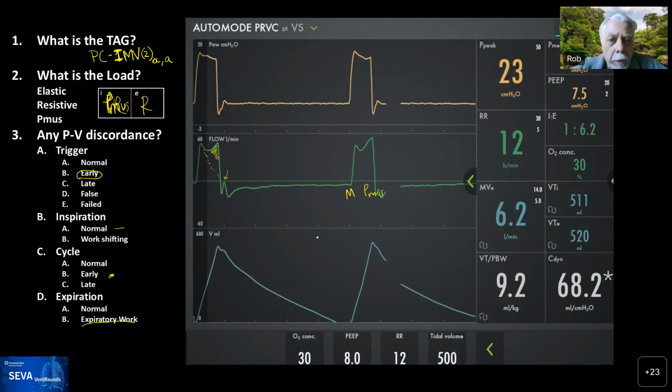So yeah. Auto PEEP causes failed triggering. And in this patient in particular, what I can tell you is that when we repeated the measurements, we were attempting to wake up the patient, during a spontaneous awakening trial, hence the mode. So we knew that there was going to be discordance, and we wanted to avoid double triggering on this patient while on volume control.